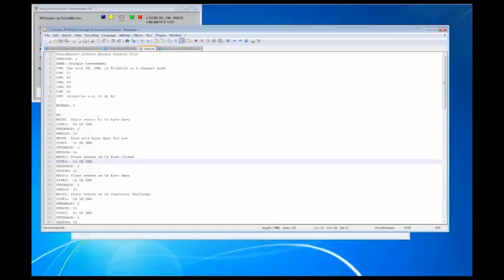So I will start at the beginning, and you're going to notice one thing. Message 1 or MESG 1, and you're also going to sometimes see MESG 2. Now, what that means, message 1 is going to display before the next one in line runs.